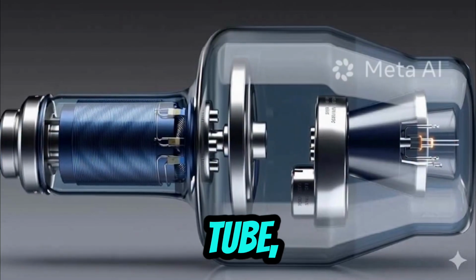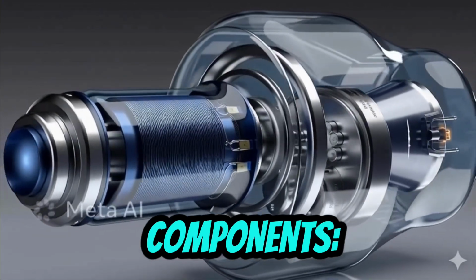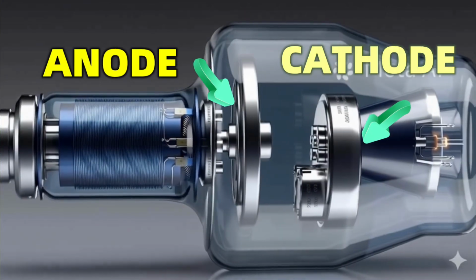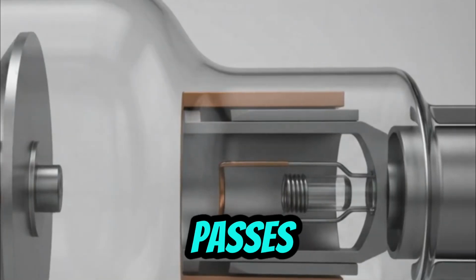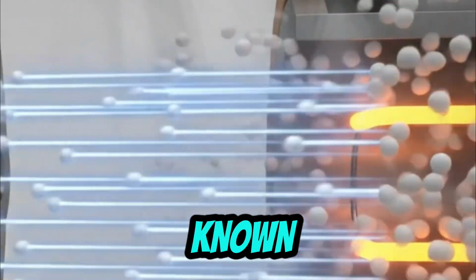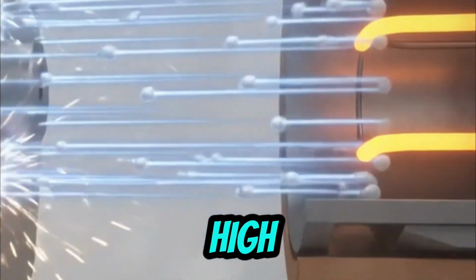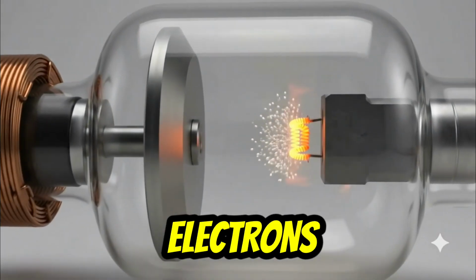Inside the X-ray tube, enclosed within a vacuum glass envelope, are two essential components, the cathode and the anode. The cathode contains a tungsten filament. When an electric current passes through the filament, it heats up and releases a cloud of electrons through a process known as thermionic emission.